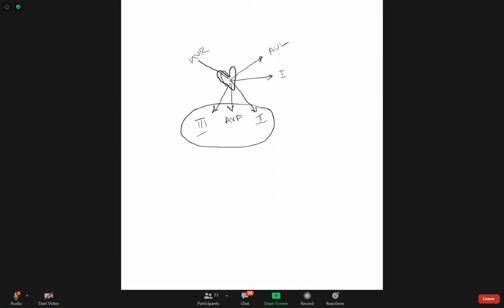So when you look at it, lead 2 and aVF, lead 3, they look at the heart from inferior, from below the heart. So that's why we call them inferior leads. Lead aVL and lead 1 look at the heart from the lateral border, so these are called high lateral leads. Okay.